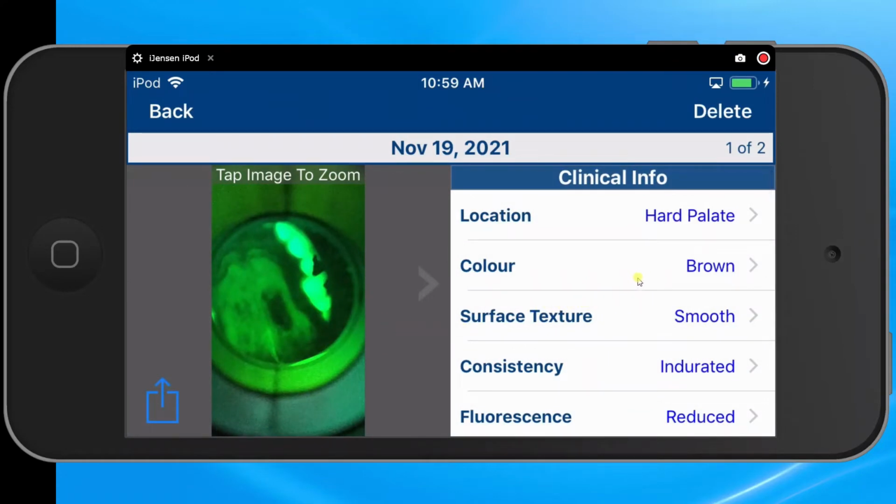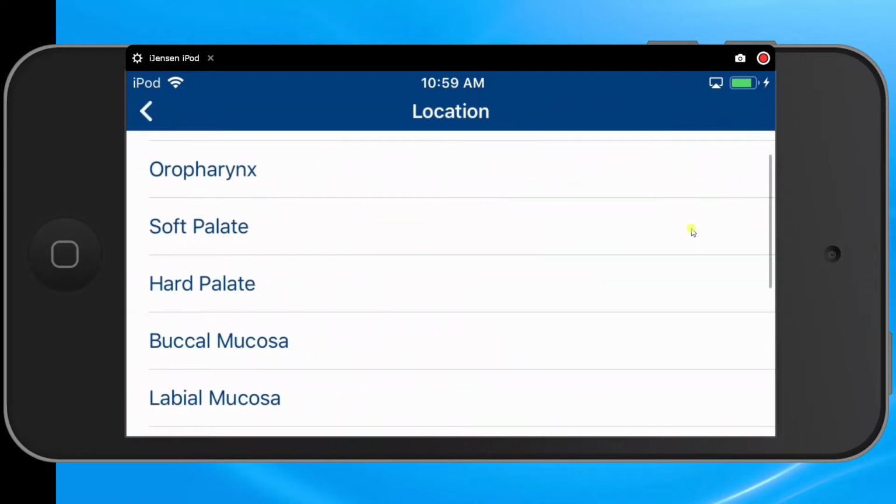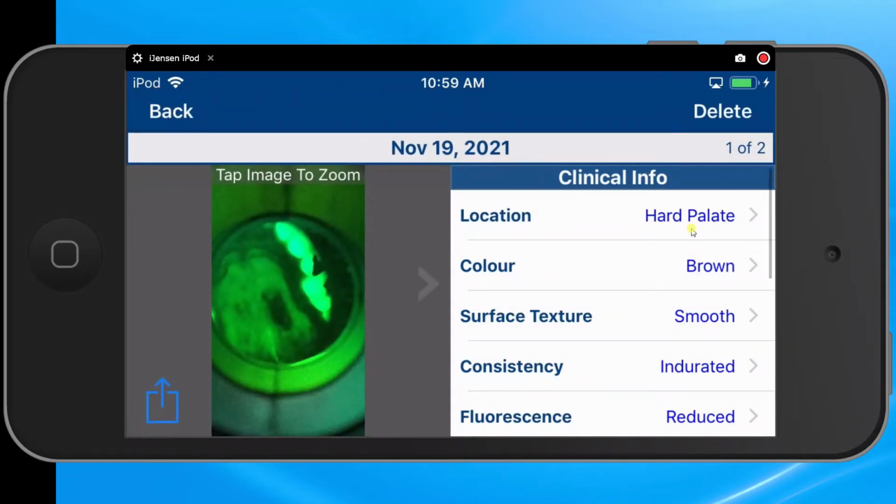And then from that, again, all of the information that we have put in, don't forget, we can always add or adjust or edit. So again, this is information that will be included in the picture. So the more information you have there, the easier it will be for you to use, both for recollection as well as for communication purposes.